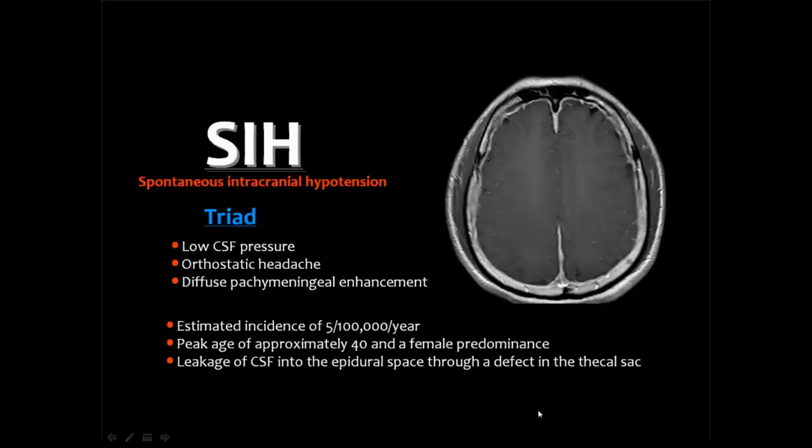Then we come to one of the causes of diffuse thickening and enhancement of the dura, which is known as spontaneous intracranial hypotension.